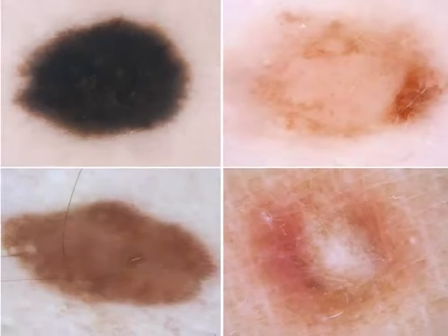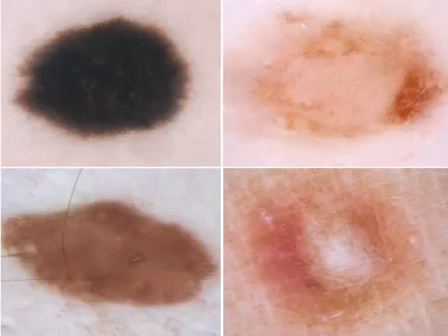This nevus has a structureless center, it's structureless brown, and a reticular pattern at the periphery. This lesion here is a dermatofibroma. You know that it has a structureless center, which is white, and reticular lines at the periphery. But this podcast will not deal with lesions that have structureless pattern in combination with other patterns. This podcast will deal only with lesions that have only one pattern, which is structureless.